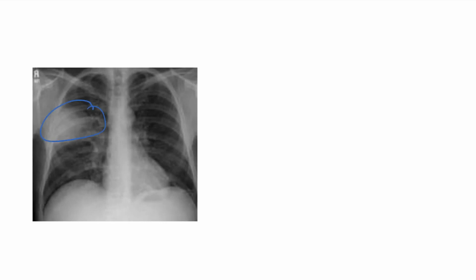This PA view shows right upper lobe consolidation. This is probably a case of bacterial pneumonia.